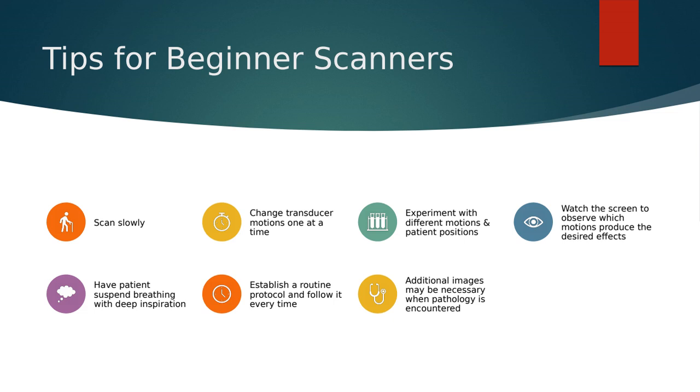You also want to make sure that you're taking additional pictures, especially if you see something that you're not sure of. When in doubt, take more pictures, because you can have people critique you on more. If you only take one picture of a pancreas, I can just tell you if that one picture is good or bad. But if you take 15 pictures of a pancreas when you're first starting out, then I can say, okay, this one is a little bit better than this one because, right? Or, oh, this one's really good because you see how this happened when you went from this picture to that picture. We can use comparison to help us when you're taking a lot of pictures.